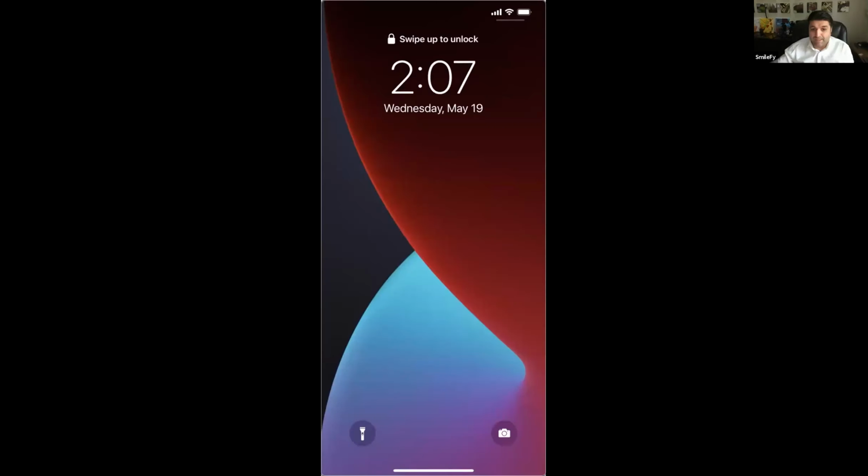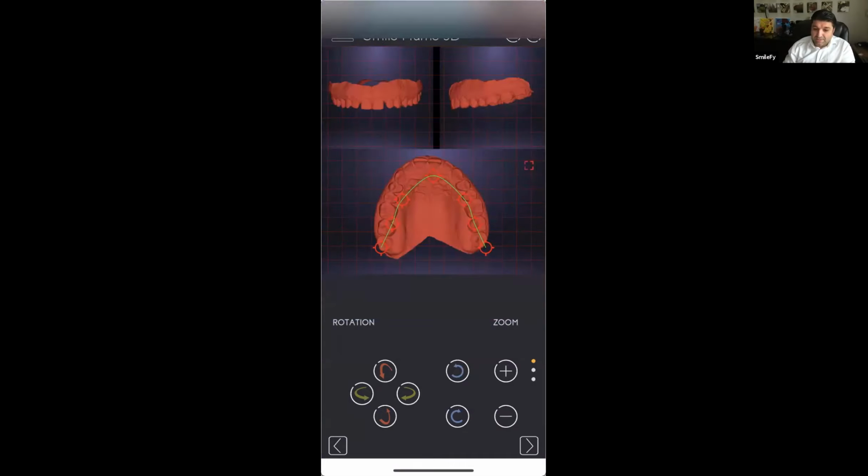Okay, so now I have 22 degrees set. That should be good. So back to my screen. I do have the occlusal position, perfect frontal and perfect profile, right? Perfect profile and perfect occlusal. Important, always scan with the palatal area so that we see the midline, and we can rotate and do everything based on the midline.